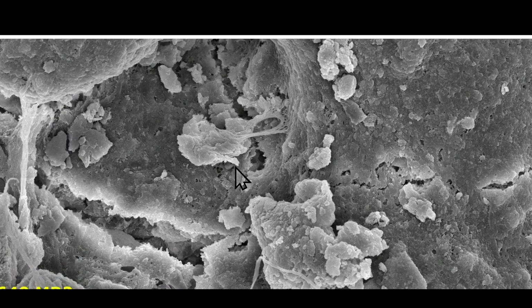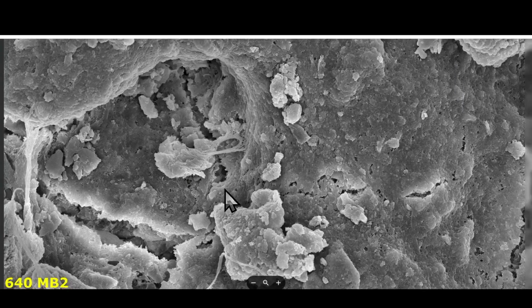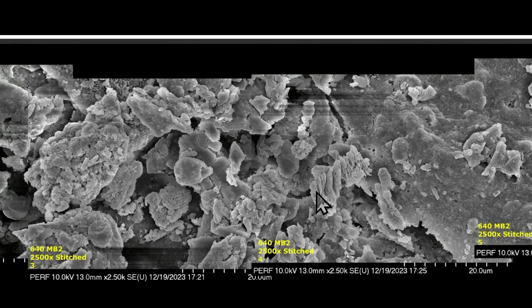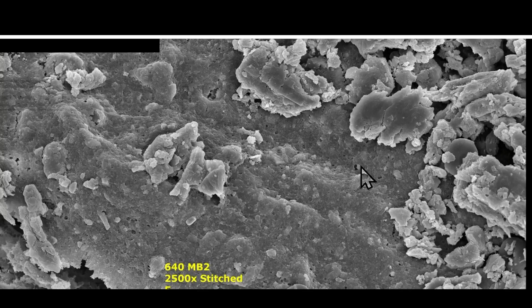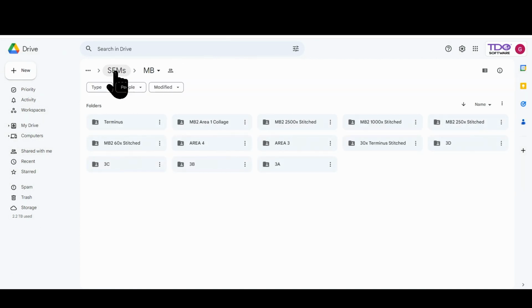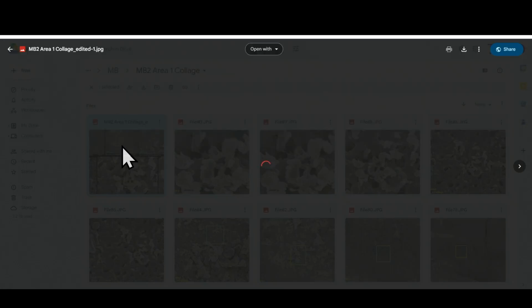And here you can see the mineralization front is starting to be demineralized, but you still can't see any dentin tubules. So there's a wide variety of findings in this tooth. When you really look at it carefully, there are areas where you can see patent dentinal tubules, and other areas where there's a lot of pulpal tissue still present.